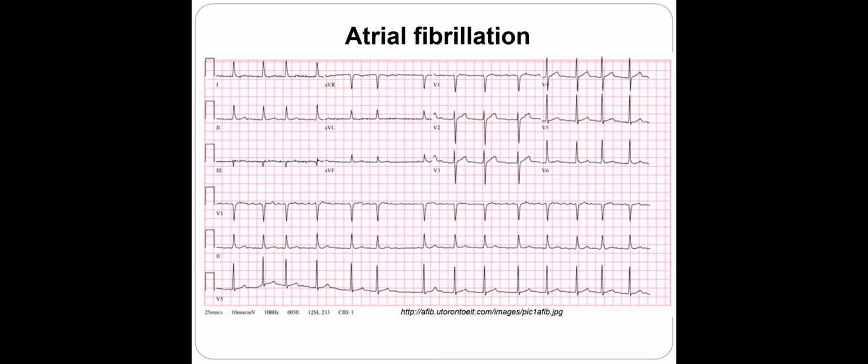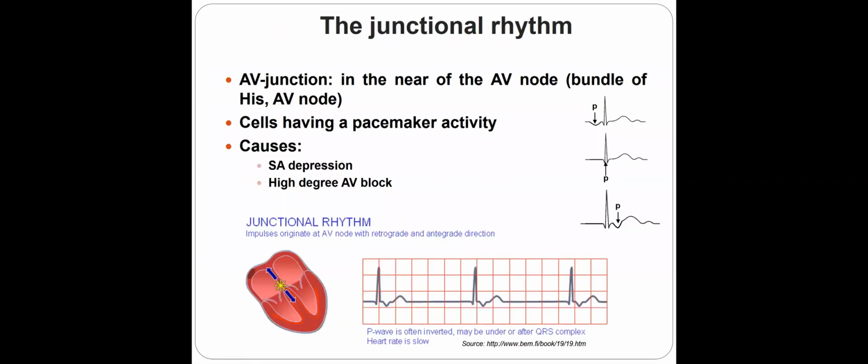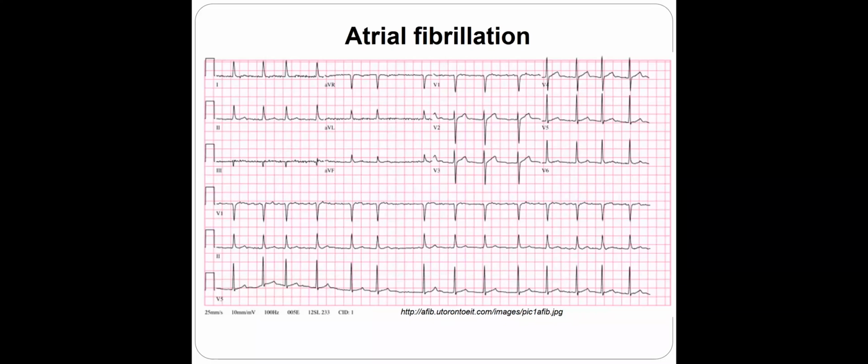Now here, what you can see, we do have arrhythmia absoluta. Okay, this is let's say the rhythm strip. And there is no P wave. Yeah, you can see some fibrillatory wave, but sometimes you can see some noise. What does the noise mean? How can you differentiate between the noise and the fibrillatory waves?